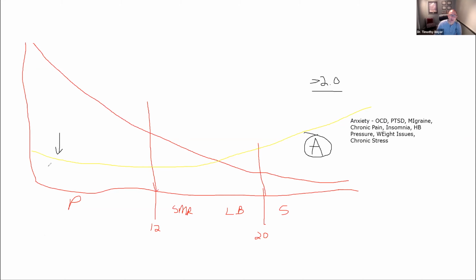And the problem with that is these are where I'm supposed to be doing all my recovery, okay? All my restoration at night all comes in these frequencies down here. So if there's not a lot of them, their heights aren't high, then what I know is that we're not filling this gap here, okay? Especially the lower I go, 0 to 4 hertz.